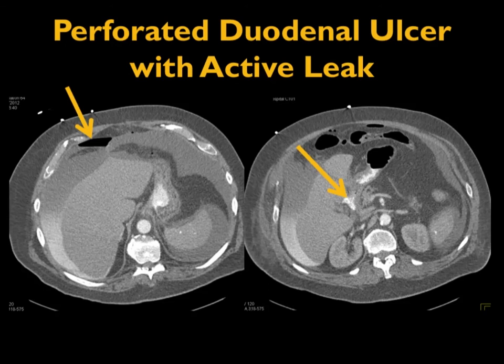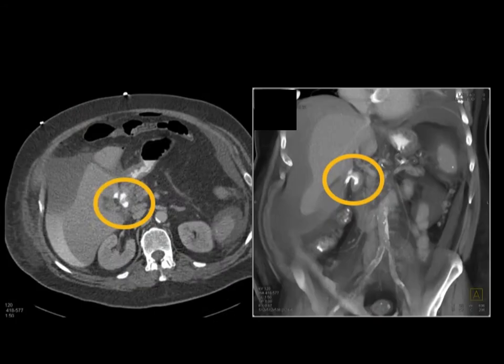And this is a great example of a patient with a duodenal ulcer, pneumoperitoneum, which you can see. And then you also can see the perforation is at the duodenum. You see contrast layering along the liver. That patient has free fluid in the abdomen. The patient has a perforation, and you can see the free fluid tracking downward. So a very, very nice example. Now this example also shows the positive of positive contrast material.